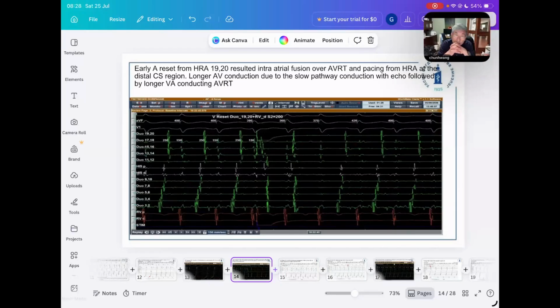I also thought, when I saw the patient in the emergency room, it was a short RP tachycardia, with the retrograde P wave just after the QRS complex. Considering the patient's age and sex, I guess it looks like AVNRT, but in the emergency room the tachycardia was also of the other type.